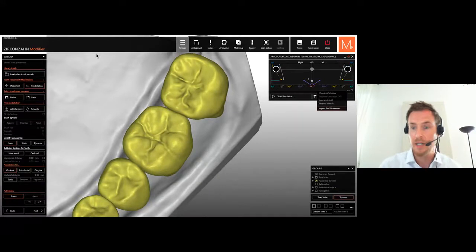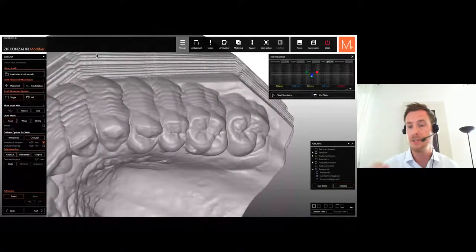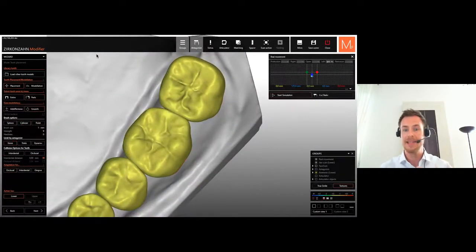But now can we come to the real movements? Because I didn't import them yet. After importing the real movements, I'm able to calculate a kind of summary of those movements. And regarding the summary, I'm able to place teeth now in individual position. That makes it better aesthetically because I have the movement, and I'm able to cut the occlusion surface regarding the recording.